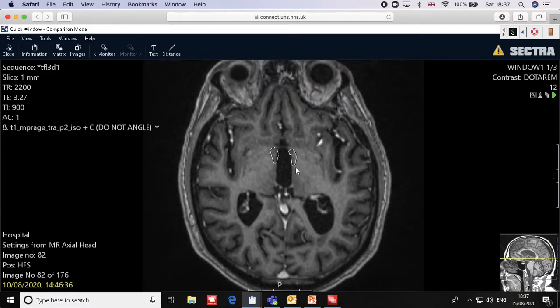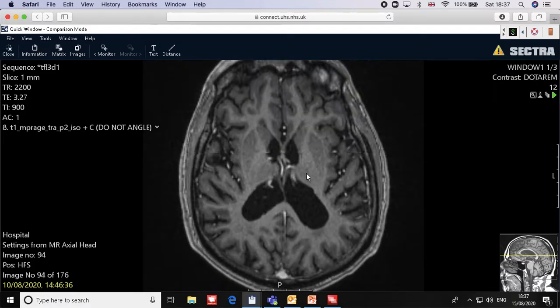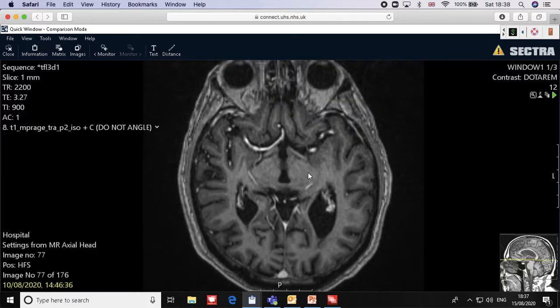Anyone who's doing a report or something, the annotation will remain there. So please make sure that after doing a few annotations or a few things on the MRI, you just have to clean it up. Make sure of that.